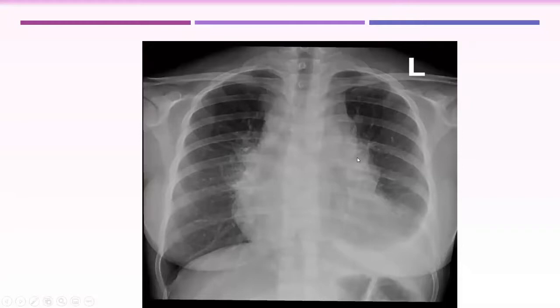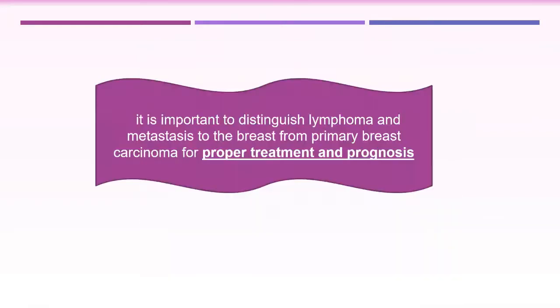Look for this lymphangitis, reticulonodular opacity radiating from the hilar regions, and the thickening of the pericardium, and the left pleural effusion demonstrate pleural thickening and enhancement in a case of lymphoma. That was our case of lymphoma.